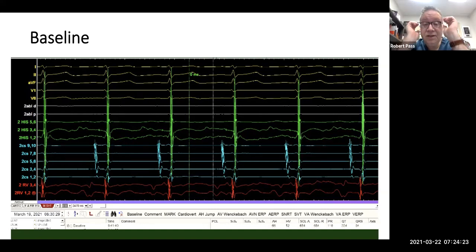Right, but the coronary sinus doesn't tell us a lot about right-sided pathways, right? So the point I'm trying to make is simply that if the coronary sinus pattern is normal, you're absolutely right that it rules out or makes it much, much less likely that there is a left-sided pathway. But it doesn't actually tell us about the right side, but that is true. It has essentially more or less ruled out an antegrade conducting WPW left-sided pathway.